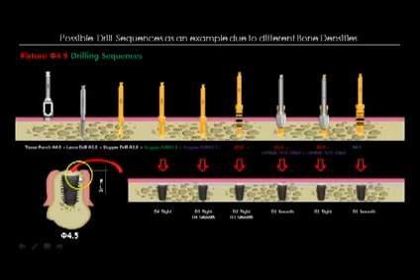Now, the core of the implant, remember, is 3.3. So that would be my recommendation. Drill out to 3.3 for your 4.5 implant. And could we place the implant there? Yes, that would be considered a D3 tight or D3 dense, or a D4 smooth. Okay, so you can see the different nomenclatures.